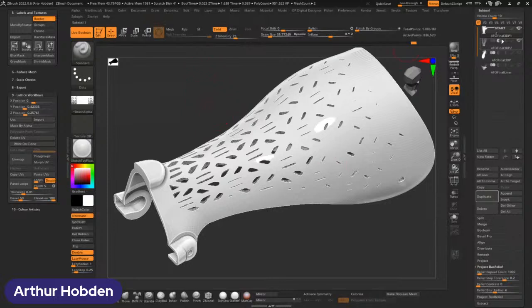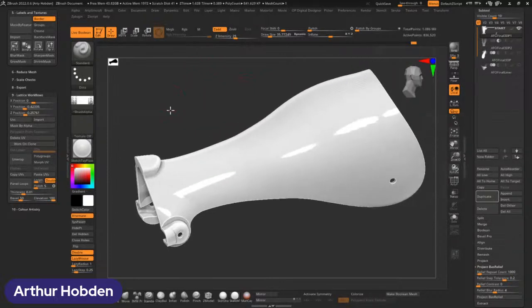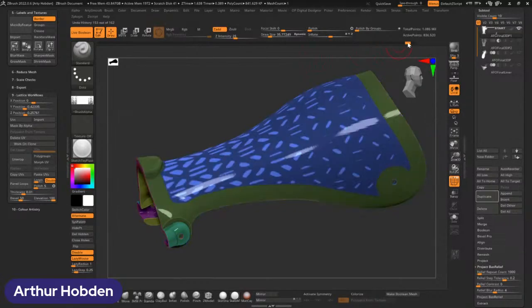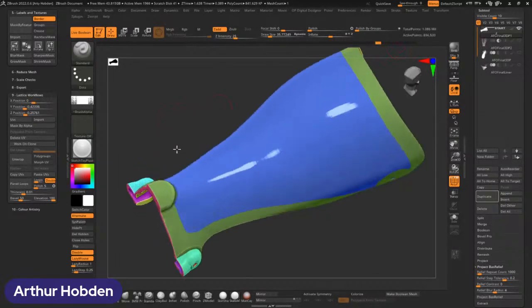I'm going to just clear that for now. Go back to what we had before. So this one, let's just back up a bit. So we have that grouping.